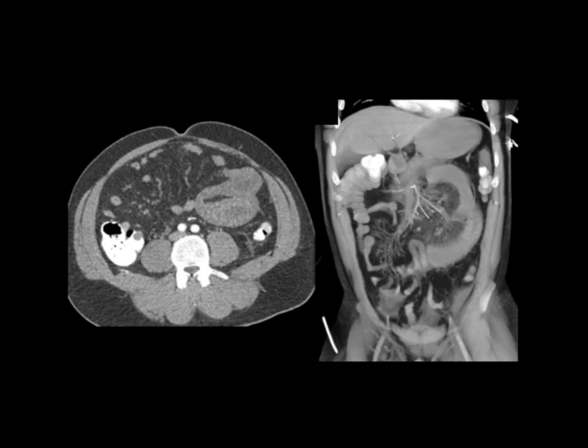Then you look at the 3D image, and you can see that the loop almost has a 3-shaped appearance. Then you see very prominent vasa recta going to the loop, and you see very small vessels. And you say, okay, what could this be? Well, obviously this loop is abnormal, this inflammation. It's not diverticulitis. It's not carcinoid syndrome. There you get a desmoplastic reaction, and you see mass in the mesentery. Could it be Crohn's? I guess you can think about Crohn's, not the world's best location. And usually with Crohn's, there's diffuse wall thickening rather than this kind of dilated bowel and this lack of enhancement.